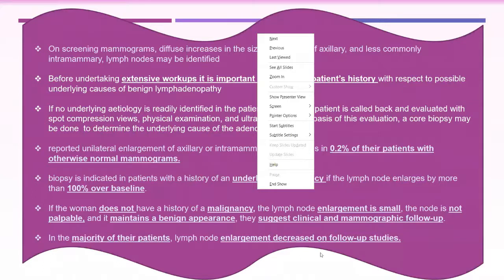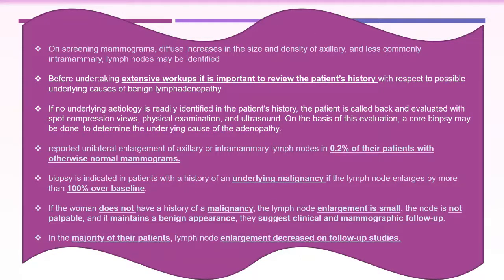And if we see a lymphadenopathy, it is seen, they said, in 0.2% of patients with otherwise normal mammography. And we have to compare with previous. If the patient has an underlying malignancy and the lymph node has enlarged by 100%, meaning double the size, then we have to recommend biopsy.